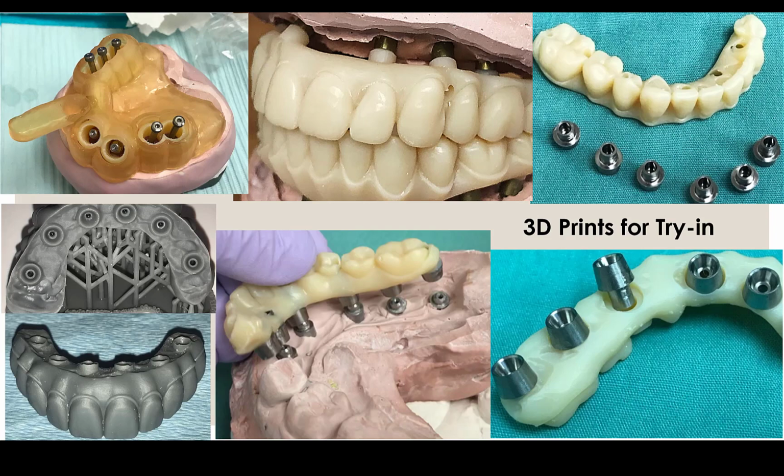Once you have a verified soft tissue implant model, you can attach scan bodies and scan your new model back into the case in PDC. You can create a new design or bring in a previous design. You can then create a try-in prosthesis and verify implant placement, aesthetics, centric occlusion, and vertical dimension.